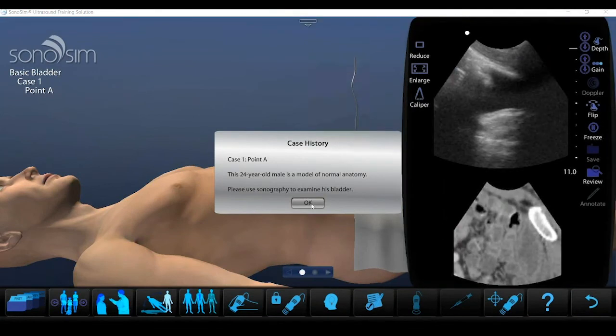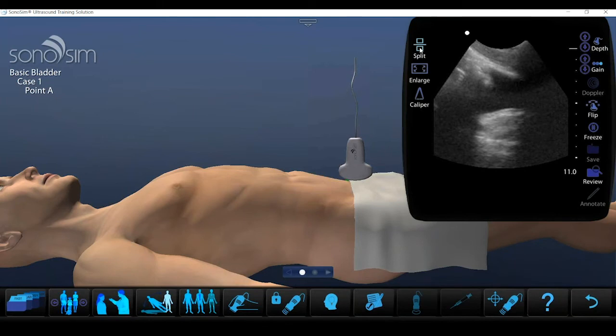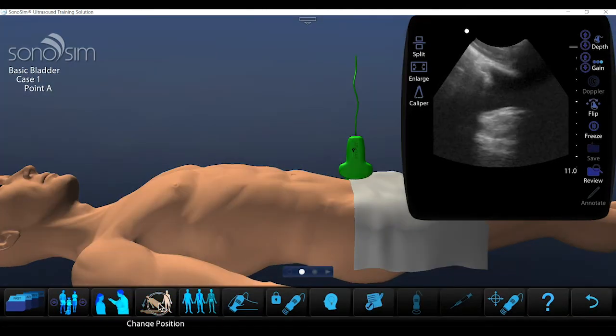And all of our real patient data, in this particular case, sometimes includes MRI and CAT scan, so that's what you're seeing here. And for this purpose, we'll just take that away for a second. So the students will be able to use all of these tools available.